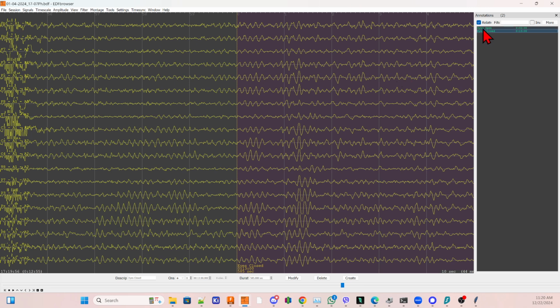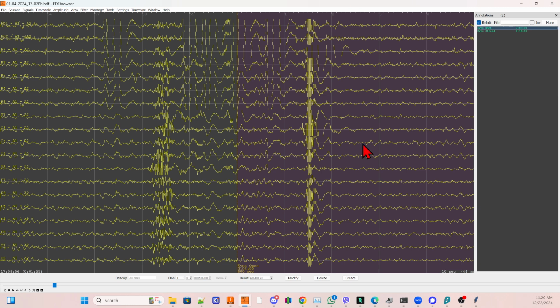And now, these are all the periods this person had. This was their first recording. Now I'm going to annotate all of the eye blinks and other noises. Now the scroll wheel comes into play, and also your keyboard. When you hold down, and I repeat, hold down Shift, and then click this, so we can clearly see it. There's an eye blink here, and there's a whatever noise this is here, right from the beginning.